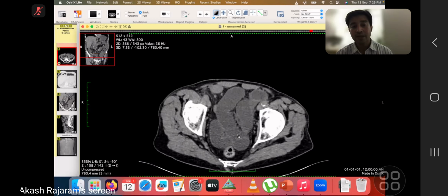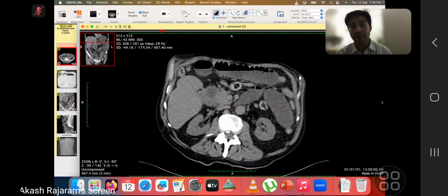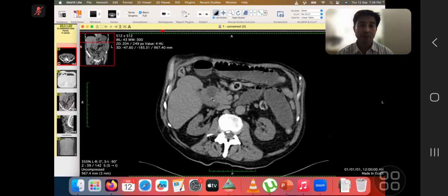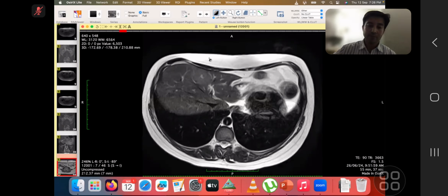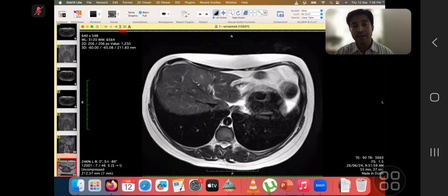And also you very well mentioned that you saw the gallbladder, and you mentioned that there is some subtle focus of air in the gallbladder, which is suggestive of a duodenal fistula. So this is a case of a gallstone ileus. Okay. And in the next case, initially, it is very difficult. These lesions are quite difficult, and you didn't see it at first, but you did very well in this case.